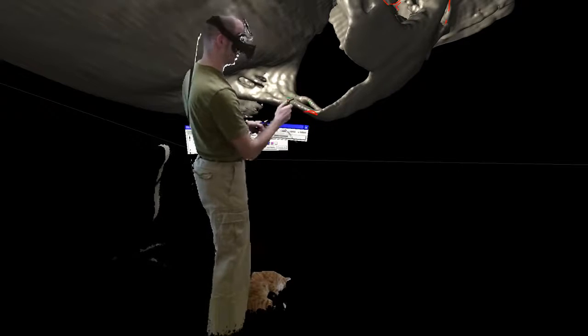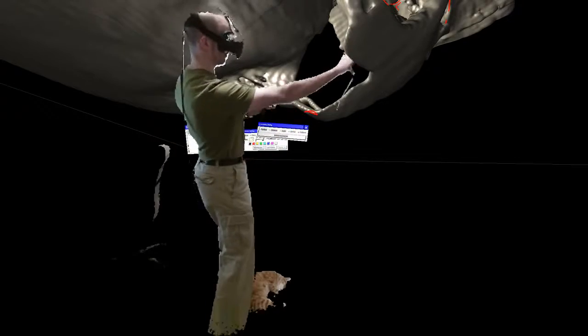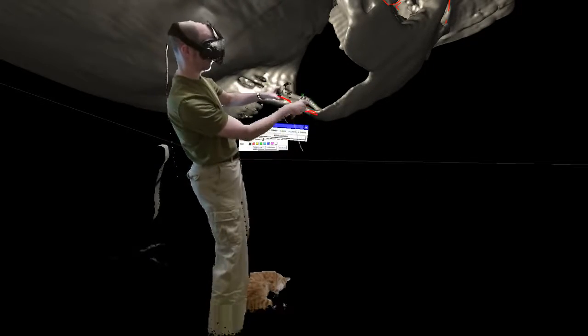And this is not supposed to look like that. You can see that the cheekbone is fractured here and here, and the whole thing is just pushed back. This whole part of the bone is pushed back, which is why it caused a fracture there and there.